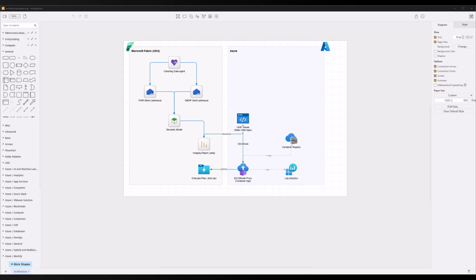As you notice, we are depending a lot on work that's already been done, especially when it comes to Microsoft Fabric. So we are anticipating a Microsoft Fabric HDS workspace already deployed with information already loaded from your DICOM services. So what we are expecting is that it's been ingested and flattened to silver and transposed into gold. If you're unaware of how to do this, I'll drop a link in the comments talking about how to get to this spot where we're starting.